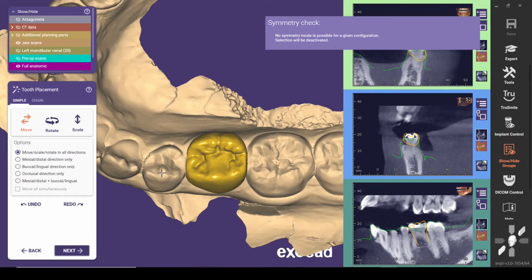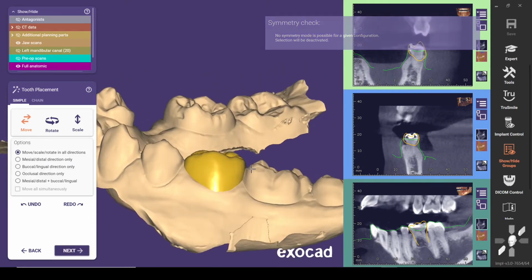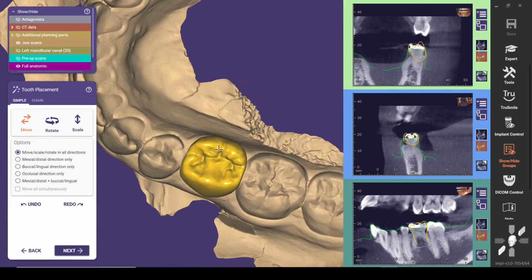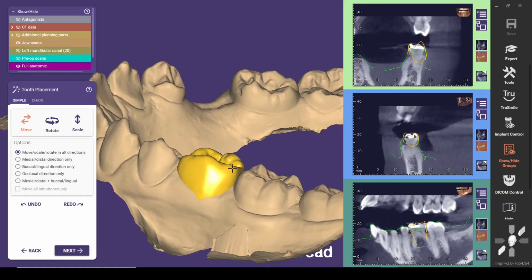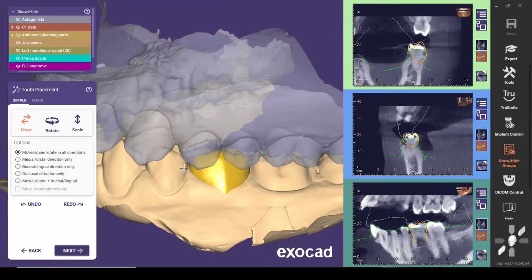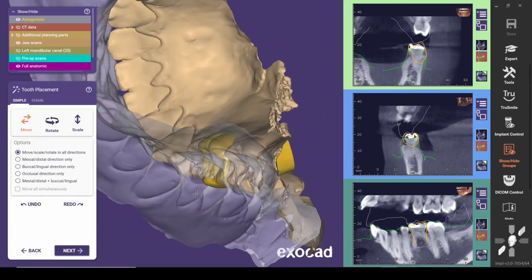In ExoPLAN, you lose some of the functionality of the wax ups. Now in ExoCAD Galway or 3.0, you can do an automatic anatomy adjustment, and the tooth anatomy will automatically adjust to the patient's antagonist jaw. But you do not have that yet with this function. Okay, so let's look one more time. Still sort of poking through the maxillary mesh there.